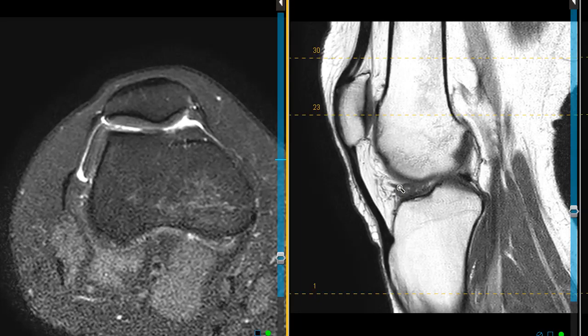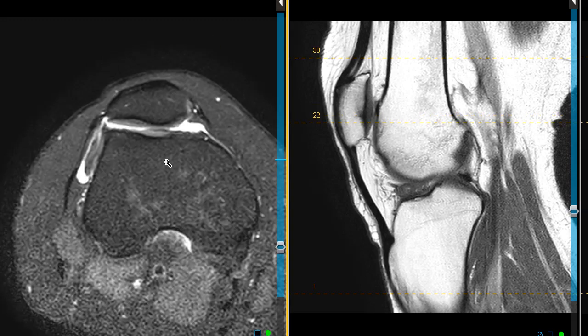Hello, this is Dr. Gay from First Look MRI, and this is a 38-year-old female who complains of sharp stabbing pains in her knee when she walks downstairs. On this axial view, we see her kneecap. We want to look at that patellofemoral compartment here, the anterior knee joint.